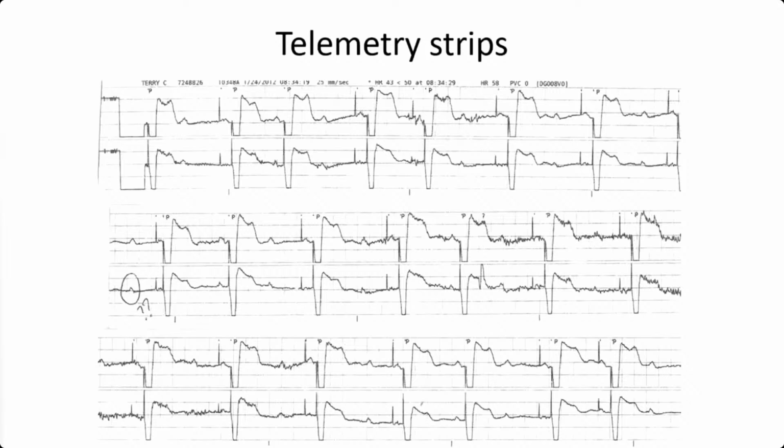Remember, it's a surgical resident. They don't know anything about pacemakers, so. Premature. He's just not sensing anything. But it's two people, Ken. You had two takers. Okay. Not very good. Come on, vote. Analyze and vote. By the way, when you take boards, you get no more than about 2 minutes per question. And that's still about the same, 2 minutes per question, I think.